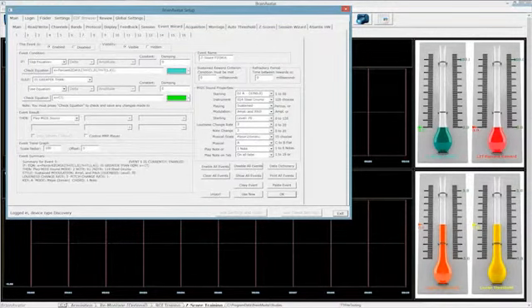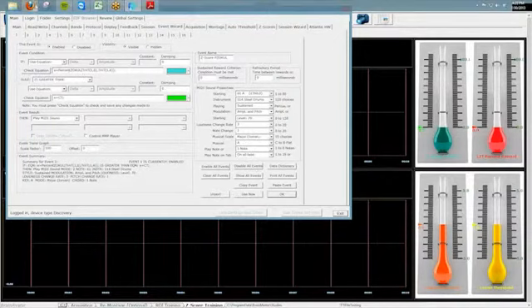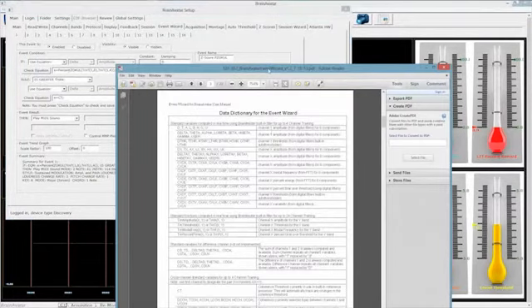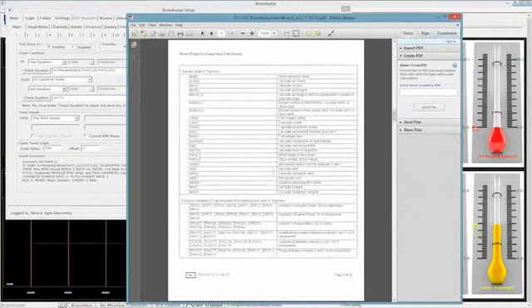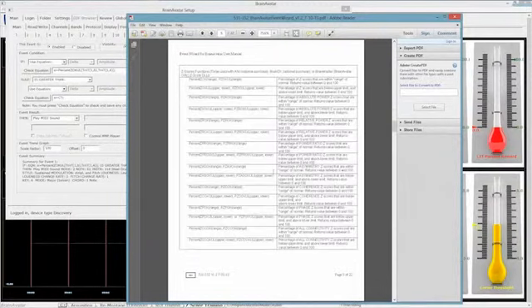For example, what we're doing in this first event right here. It says %ZOKUL, and let's look up that function real quick. Go down right here. Okay, and here are all of our Zscore functions. So what we're looking at is %ZOKUL upper and lower, which is the percentage of Z-scores that are below the upper limit and above the lower limit. It returns a value between 0 and 100.